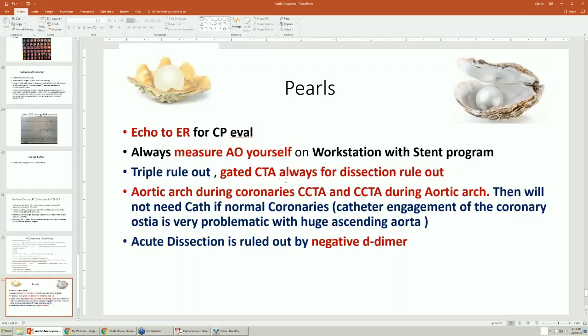And frequently, an aorta in motion looks like a dissection because you see one spot here and then one spot here. So, oh, look, there's two walls. Somebody got operated on at Tampa General a couple years ago with that because of wall motion. And you get inside and you say, oh, look, normal. And then you've got to close up again. It's very embarrassing. So all you have to do is make sure that radiology gates the study when they're looking at an ascending aorta, looking for an aneurysm.